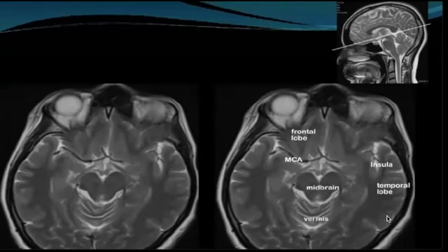This is the temporal lobe, okay? If you go interior to the temporal lobe, that's the insula, okay? So the insula is here. This is the part that is interior to the temporal lobe. So the temporal lobe is supposed to be most peripheral. But the CSF in the picture above is black.